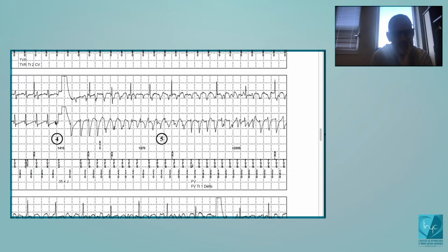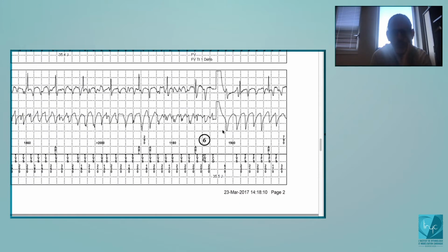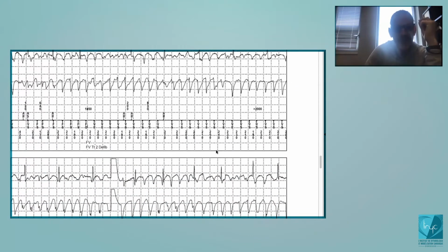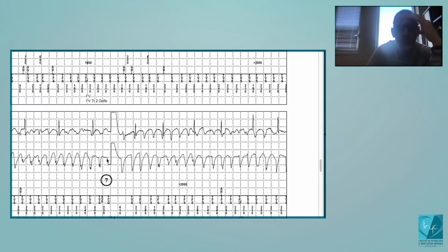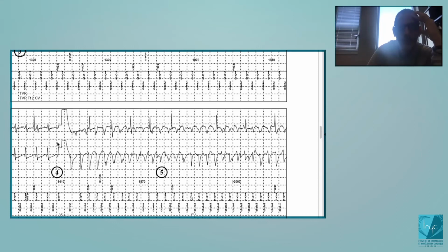And if you induce an arrhythmia, you always have to remember that there is a huge risk that you will not reduce the arrhythmia with the same energy. That's the concept of upper limit of vulnerability. So these first two tracings are there to explain that when you implant an ICD, if there is a high defibrillation threshold, not only is there a high risk that you will not reduce the arrhythmia, but there is also a high risk that you will induce arrhythmia with an electrical shock.